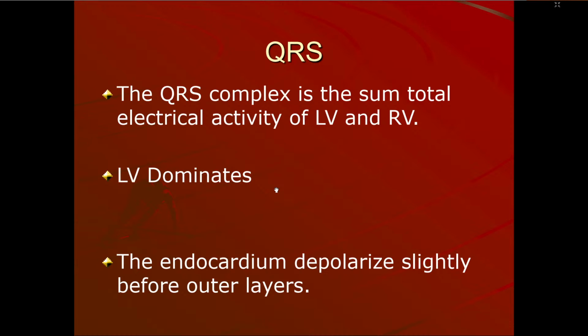So it's like that. Whichever lead is over whichever ventricle, it will record a positive wave. The right ventricle is small, not very bulky, so you get a small r in V1, V2. The left ventricle is very bulky and has to pump blood into the whole of the body. So it is bulky, more myocardium, more electricity being produced. So you will get a tall R in V5, V6.